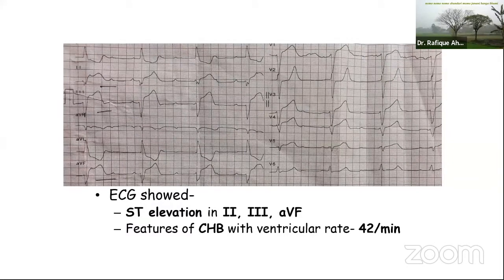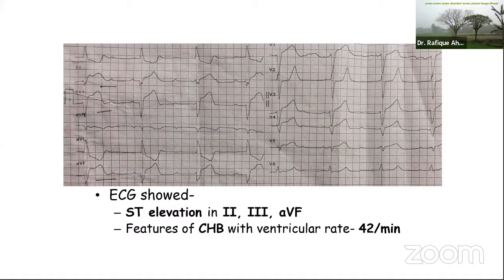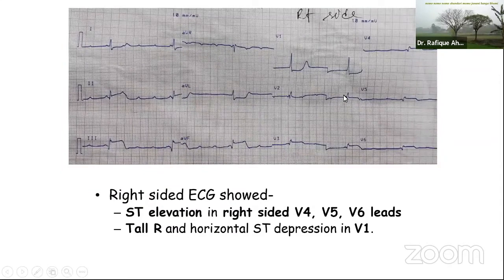What was your comment about this ECG? Acute inferior myocardial infarction. But the problem is LBBB. The patient has a bundle branch block type pattern, either a ventricular escape beat or left bundle pattern. Can you go to the next ECG, please? This one is different now. Yes, because this inferior lead shows the ST elevation with a narrow QRS, which is probably a junctional rhythm with conducted QRS. This shows the inferior ST elevation.